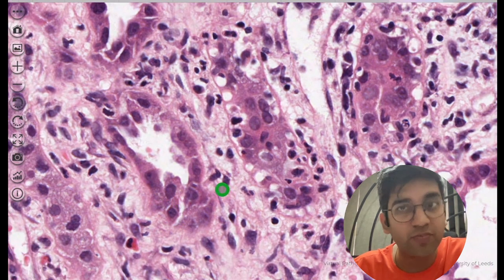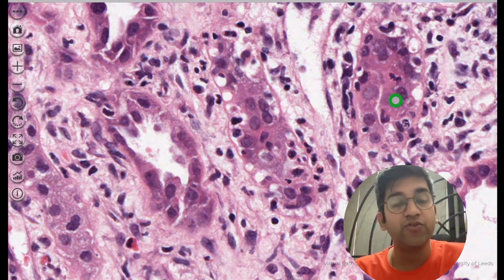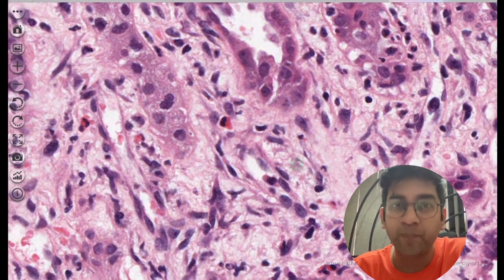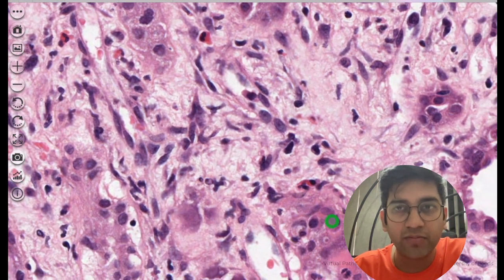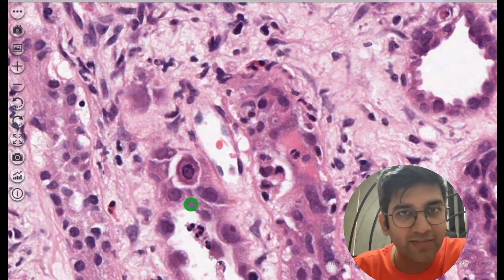Again, look at this. There is anisonucleosis by default. You'll accept that this is not the same size here. There's anisonucleosis, and a WBC is going inside it. So I can definitely brand this as tubulitis. Something of tubulointerstitial pathology is going on. Like we saw, I can see a little bit of eosinophils here and there, patchy eosinophils, which can be seen in the interstitium. Neutrophils can also be seen here, right? Again, look at this. Will you accept that's an inclusion?